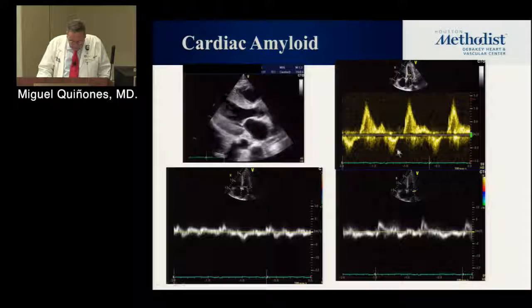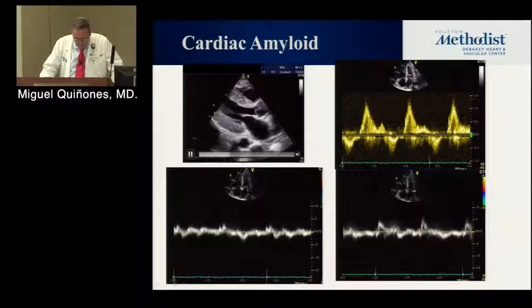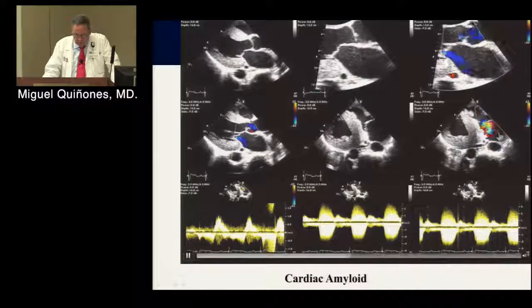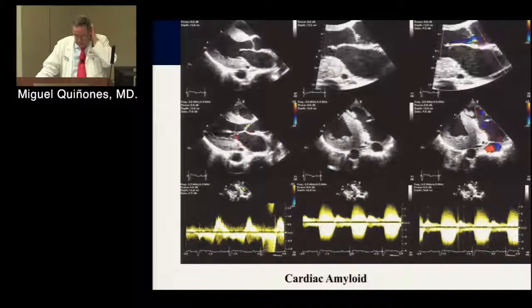Now, by the time you get this level of diastolic dysfunction, as I said earlier, with type 2 or type 3, look at the relaxation parameters by tissue Doppler, very, very poor. Even though EF kind of looks okay, this patient is in trouble. This is a patient you would like to have picked up, but this is the worst. This was actually a very tragic case.